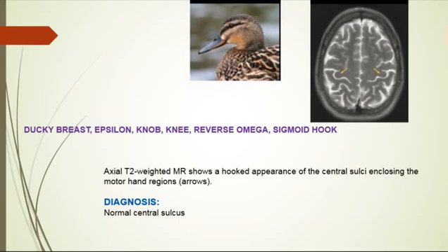When looking for the motor hand, especially in neurosurgical pre-op evaluation, we should be careful. This area usually indicates the motor hand region.